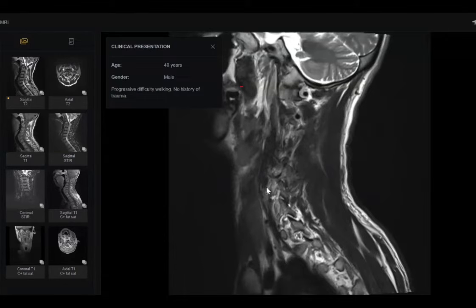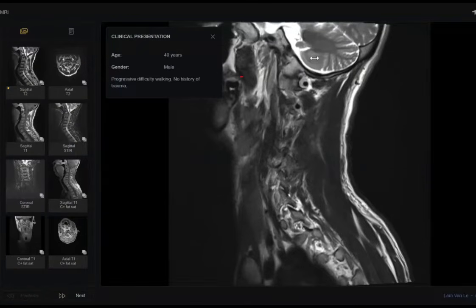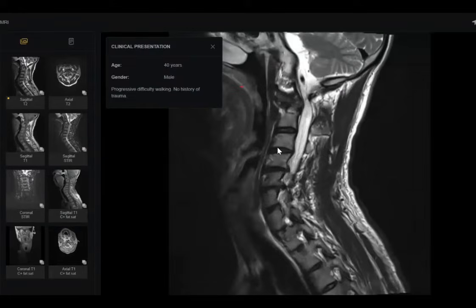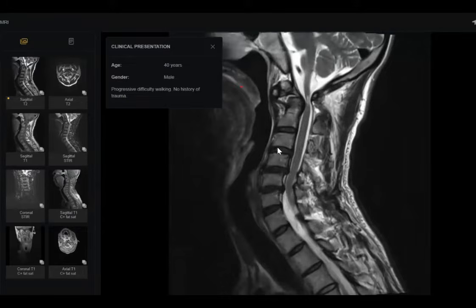According to the last case, again, there were multiple lytic lesions. It was Langerhans cell histiocytosis. It may be confused with fibrous dysplasia, but frankly, there is no obvious ground glass appearance. I think we should search, but if we had sagittal or coronal images for the appearance of both skull tables, but unfortunately, I think we have only axial skull bone windows.